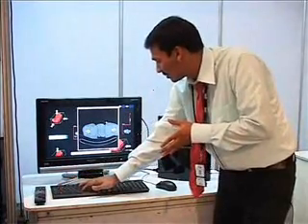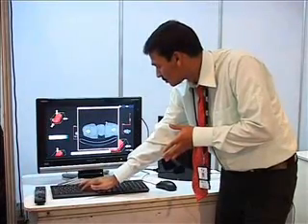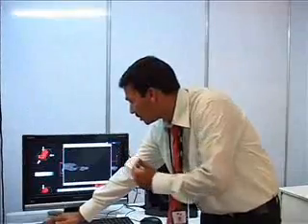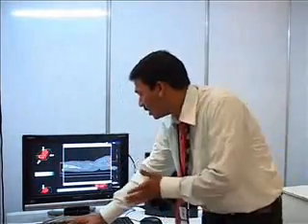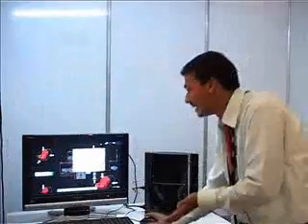If you want, you can come back. This is the front view. Now we can see the side view of the body. Now we are going inside the volume. If you want to come back, this is the sagittal view, which is the side view of the body.